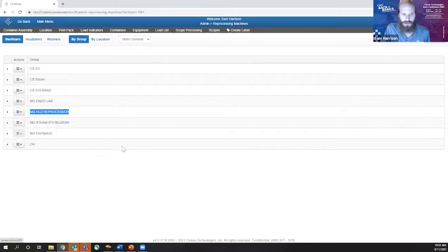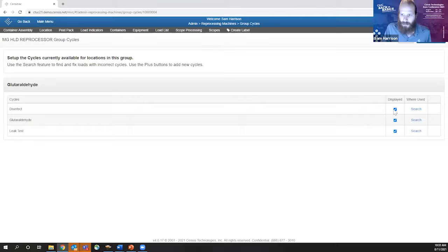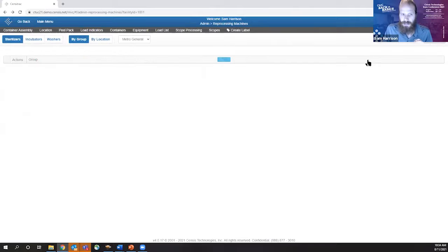So for cycles, right now, if I were to create a device here, the techs would be able to see all of these cycles, right? So we don't need them to see all of these. We just want them to see the disinfect cycle. So I'm going to get rid of that. And I'm going to save this, okay?